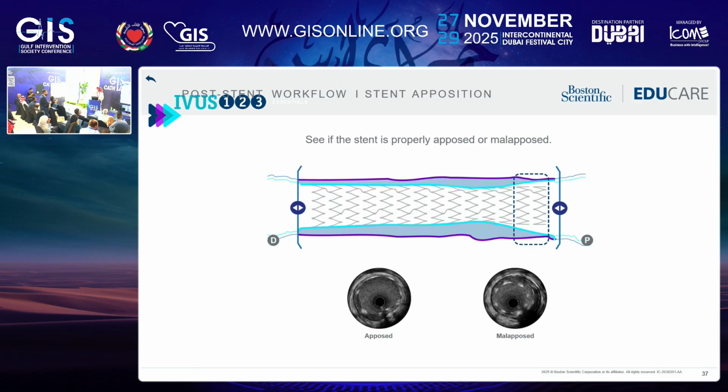Ideally, you use the same approach that you used before stenting. Yes, the same approach, so that is one of the advantages. To be fair, we also use OCT and IVUS in our lab. When you do a complex PCI, you find that you are using the catheter up to 6-7 times, and we reach for an IVUS rather than an OCT sometimes because of our concern about the contrast.